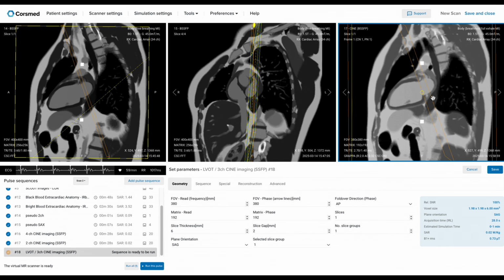And that's where we can detect the issue by comparing pulmonary versus systemic flow. By comparing these flows, we can detect abnormal communication between the heart chambers. This helps diagnose conditions like pulmonary hypertension or a defect in the interatrial septum. We don't have phase contrast imaging available right now, so we won't cover that indication in today's session.